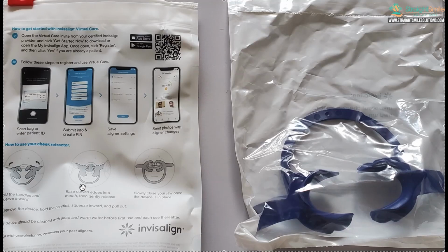Now, beyond that, if you're looking for something else, personally, I think it's a huge hassle to have to log into the dashboard every time into the Invisalign thing, because you can't do this on a mobile phone. It's kind of a pain. You have to do it from your desktop. You've got to log in. I realize it's HIPAA compliant, but there are all kinds of other HIPAA compliant ways that you can do virtual tracking with a retractor. Same concept, except you can pay a couple cents for the retractor and do tons of patients.